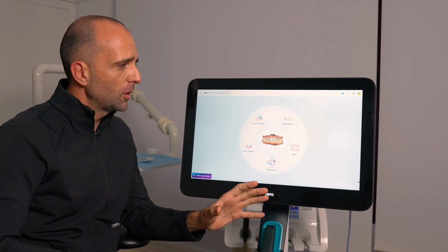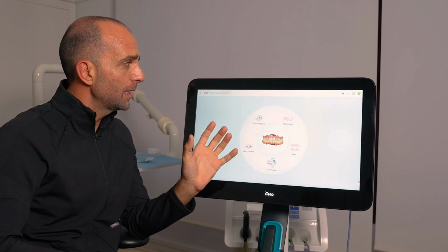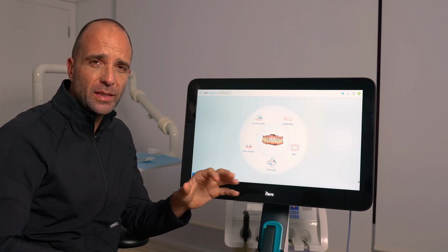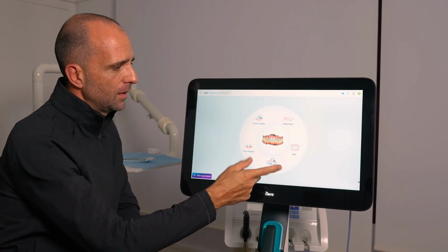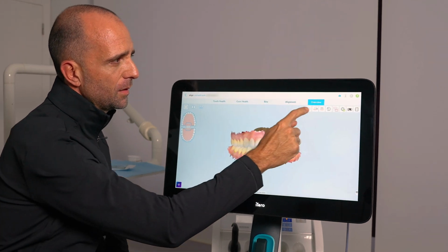Today, I will walk through a consultation of diagnostics process at Clínica Ramírez, using the iTero intraoral scans, Align Oral Health Suite, and the new and very exciting Align X-ray Insights. So now let me show you and go through a patient with several dental conditions in the Align Oral Health Suite and especially in the X-ray Insights. Again, we will go into the overview part, and here you will see the clicks.